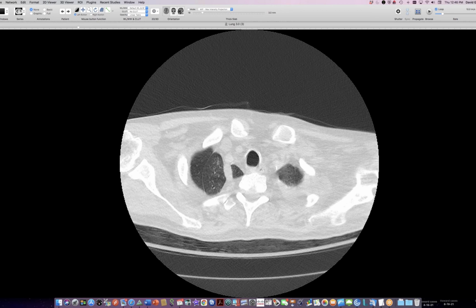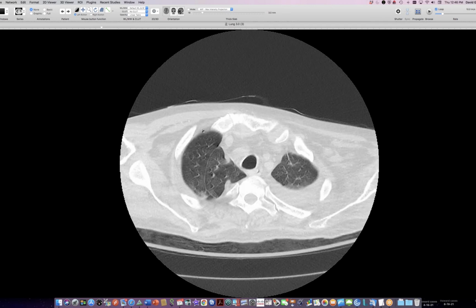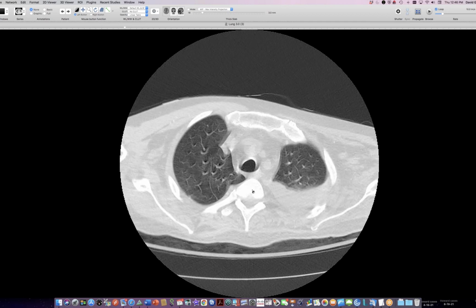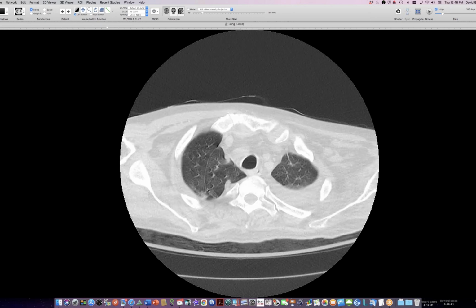But Sudhakar showed me this case of empty azygos fissure. So it's usually the result of something that has caused lung collapse on this side, either effusion, evacuation of effusion, or pneumothorax. The azygos lobe comes out from the pocket, and then when the lung re-expands, it ends up re-expanding outside the pocket. In the other situations I've seen, the azygos fissure has been compressed medially after lung collapse has resolved. I have not seen it hanging out there to the side, but there you go.